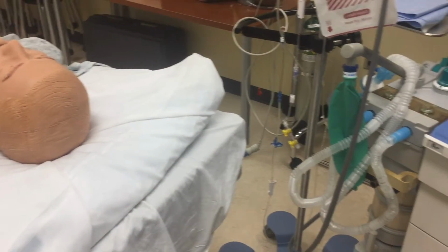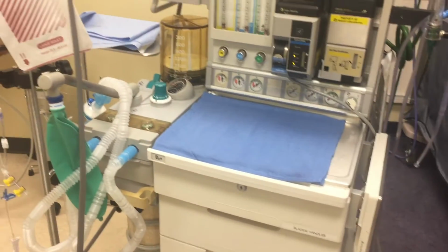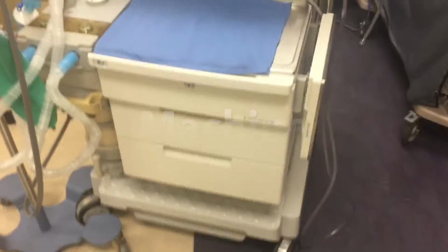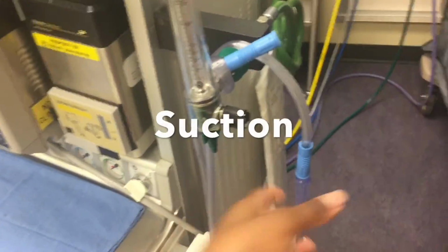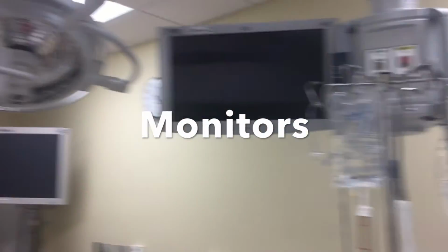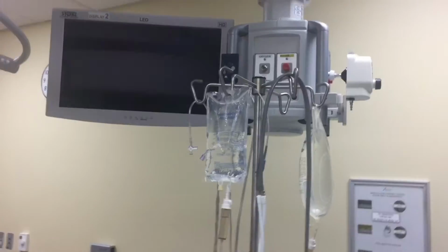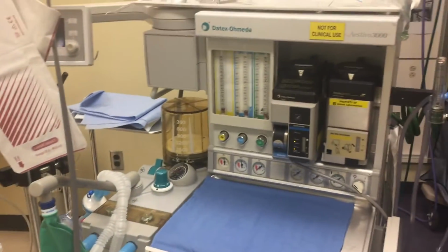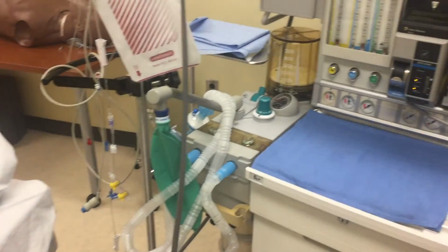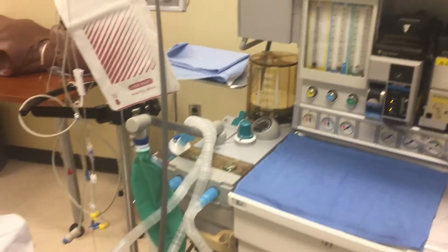Different sizes as well. In my last video, I did a simulation of this machine checkoff, and we use a mnemonic called MS MAIDS to guide us in preparing our OR room to make sure that we don't forget anything. So first is machine. Then you want to make sure you have suction on and working. Put it at the head of the bed. Next thing is monitors. So you make sure that you have your blood pressure, EKG, end tidal, SpO2, a temperature probe, and a peripheral nerve stimulator if you need it. After that is your airway. So you had M, S, M, A, airway. And those are all the things out of the drawer that I showed you guys.